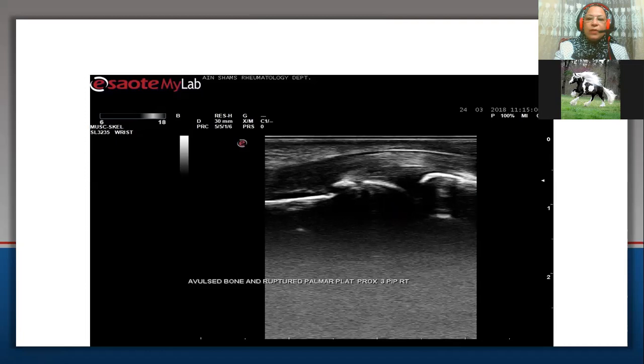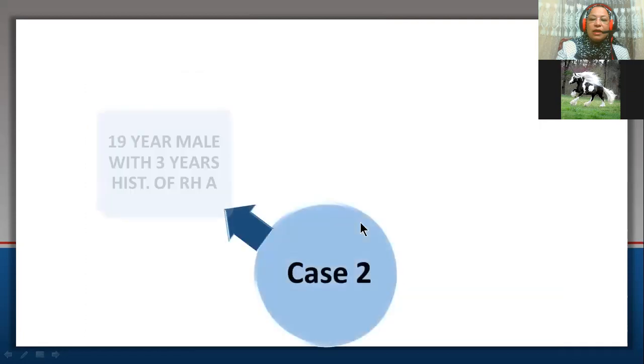So please don't miss this lesion in patients with rheumatoid arthritis, as this is an early abnormality that occurs in swan neck deformity and could be treated conservatively by finger fixation and splint to prevent permanent swan neck deformity. So please don't miss this.